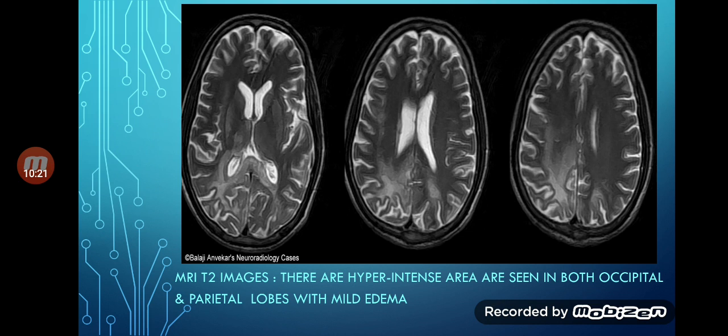This lesion involves the bilateral occipital lobes. This is against brain abscess, which in a patient with normal immunity is mostly a single lesion. So this excludes brain abscess. Two, why is it not a brain tumor?